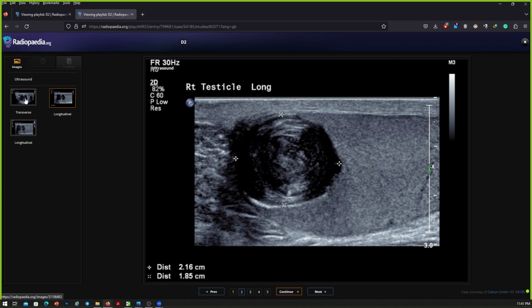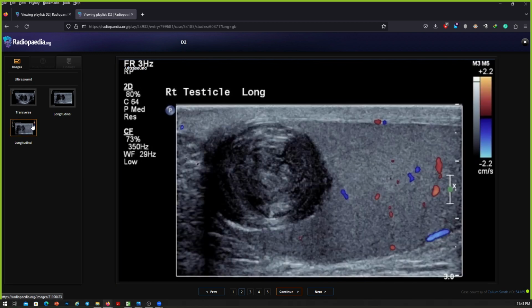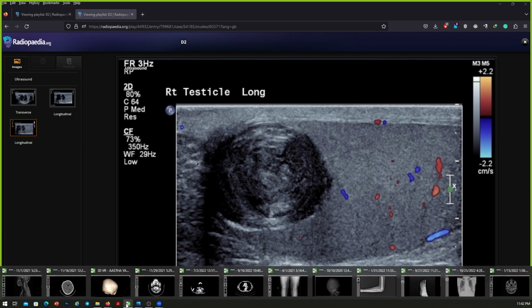I will correlate my findings with the treating physician and tell them about the mass with urology referral. Okay, other than looking at the left testis, what else would you do in this particular lesion? I'll put color Doppler, but it's usually hypo-enhancing. So would you be sure without putting color Doppler that it's usually hypo, so we'll just assume that it's hypo? No, I have to ask for color. Okay, so what would you do next? I will convey my finding to the treating physician and ask for urology consultation. Okay.